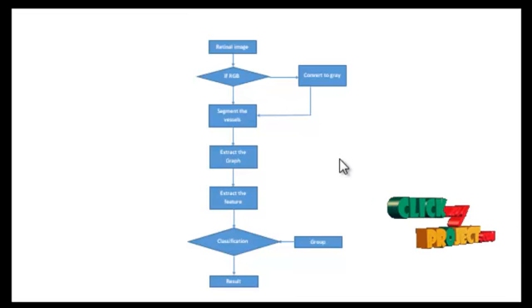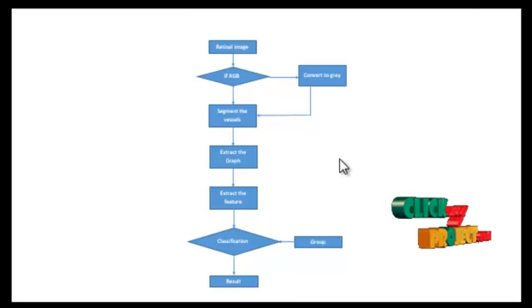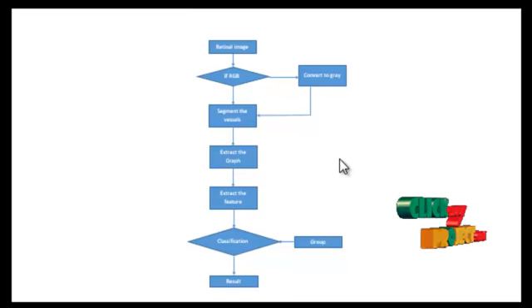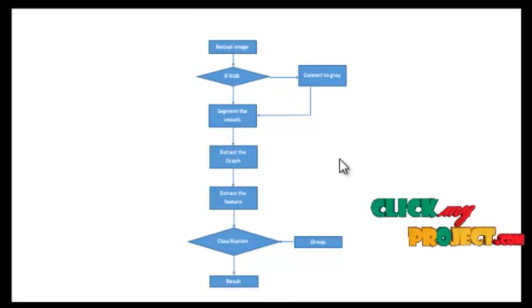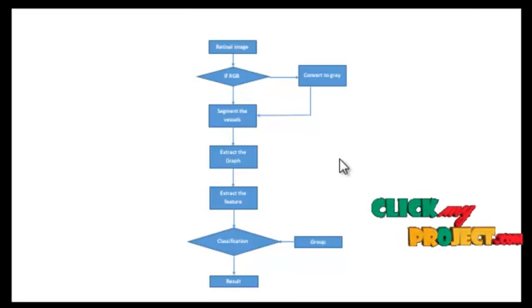In a normal retinal image, the vein thickness will not vary. For that reason, we analyze the retinal vein and artery separately. We take the veins only, find the thickness of each vein, and determine whether the given retinal image is normal or abnormal. In this process we additionally use exudates to identify the normal and abnormal classification with a high level of accuracy.